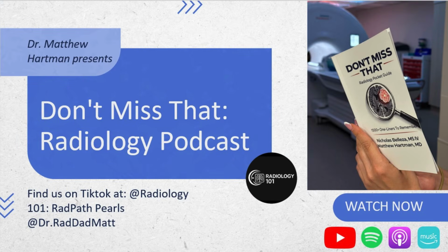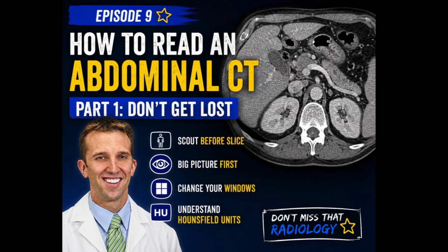Let's learn how to read an abdominal CT. Today's episode ties together several concepts we've already learned: reading the scout image like an abdominal radiograph, and then Hartman's 6 patterns of tubular structures. We'll also review windowing and Hounsfield units.